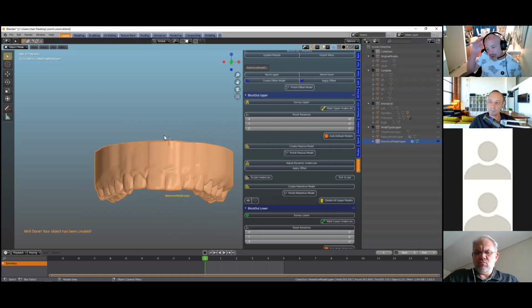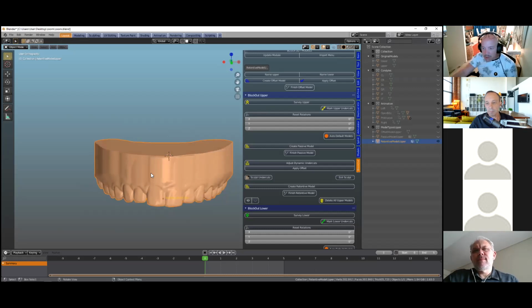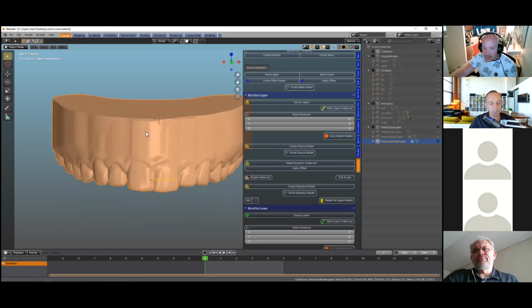And I think we should have a Zoom session only on the articulator, maybe, just to explain in great detail how this works. All right, so we've got 3 different models, and now we recommend our users to delete the models that you don't need. And that's for a reason, because if you've got upper and lower models, we're looking at 300,000 vertices.